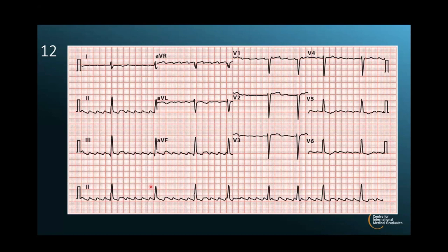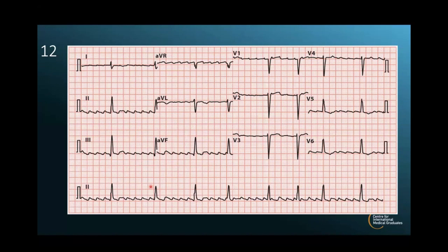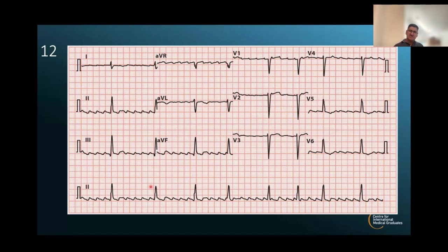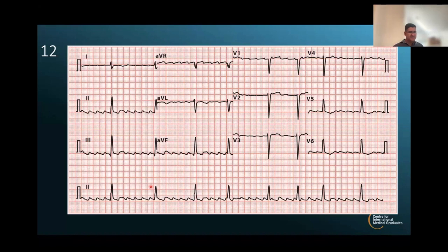Yeah, very good. So would you comment on the PR interval then? Probably not, because you don't know where the P waves and the T waves are. Correct. Because they're too close together. And also it's so irregular, right? Yeah. So tell me one more fact about this. You've got pretty much everything.